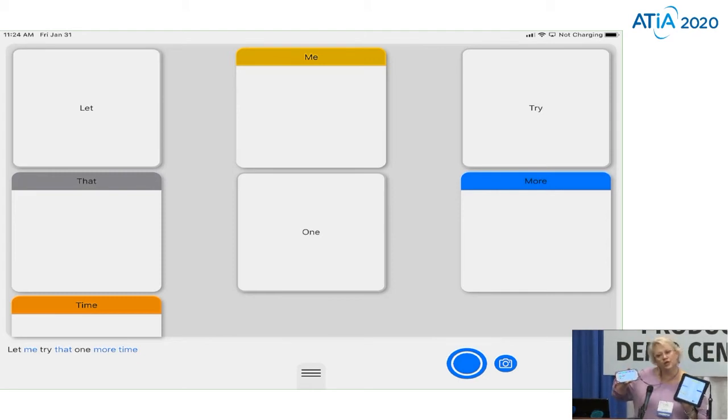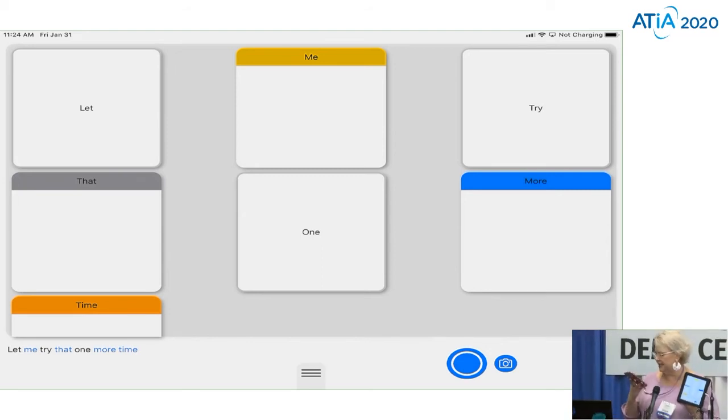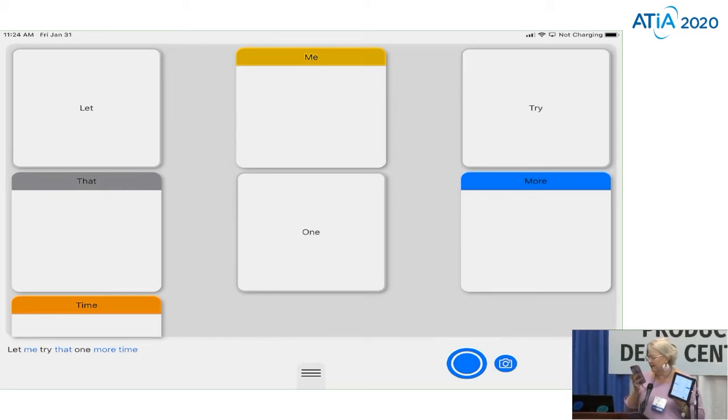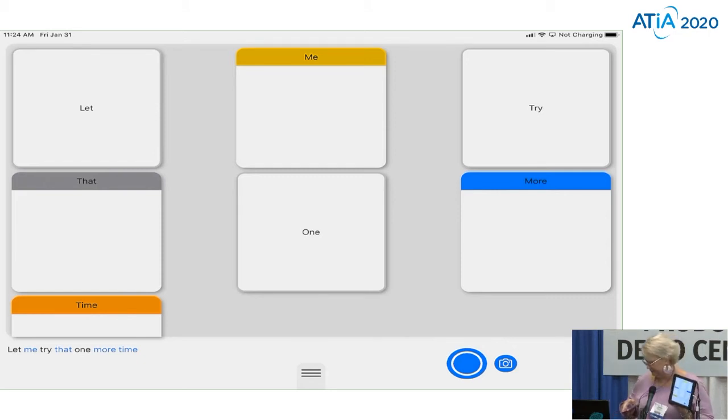And so the majority of the words are part of core 100, but if I changed it to say, I would love to have a hamburger and French fries for lunch, now from the core 100, I've got just a few words that are part of that core 100. I know it's difficult to see, but if I turn off the show words, now I've again reduced the visual complexity. And it would just reduce it to 4 symbols.